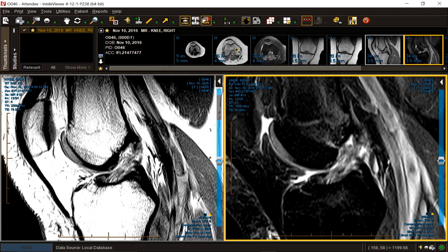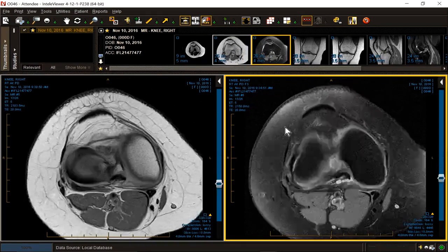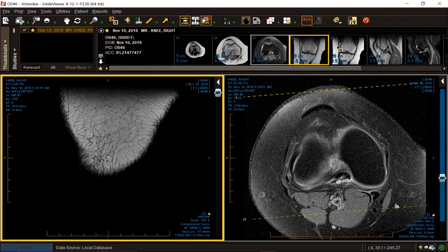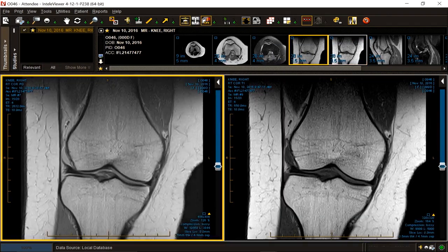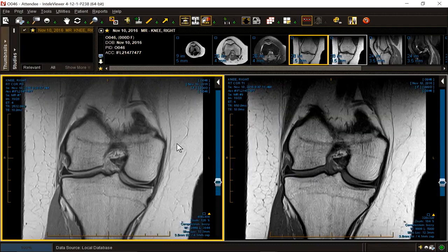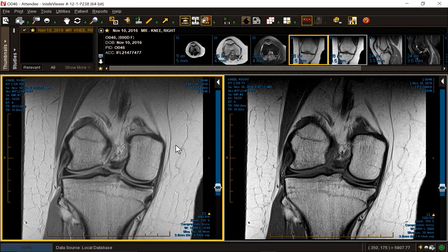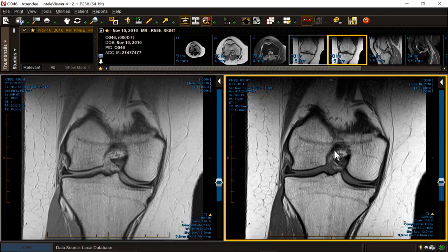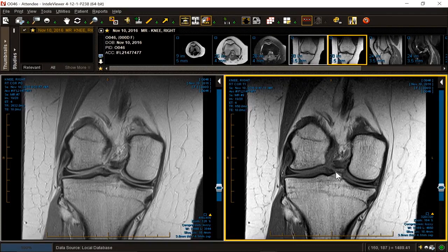And then we go back to our axial for reaffirmation, quickly. And we have a bulbous ACL, not a straight, linear celery stick seen in cross-section. And then we can go to the coronal. And where is our ACL? It's terrible. I don't know why they got this sequence, a proton density. We don't use that very often, but the T1 shows a massively swollen ACL without any identifiable straight fibers as they're buried in blood.